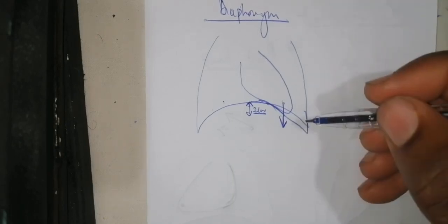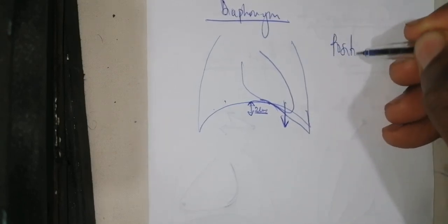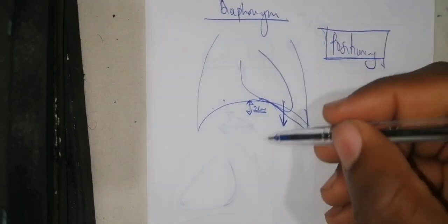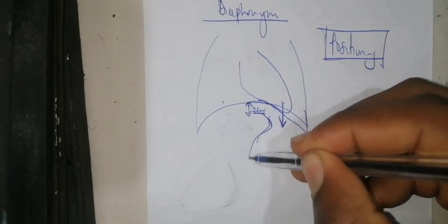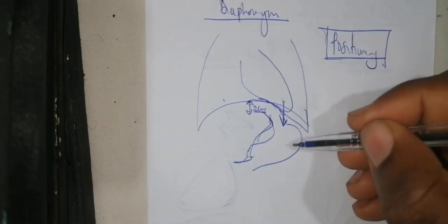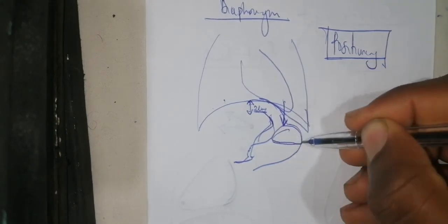Now there is another element that I forgot to tell you, on the positioning of the patient having the X-ray. We have something down here which is the stomach. You need to know that there is a stomach down here, and the stomach is going to produce its gastric air bubble.